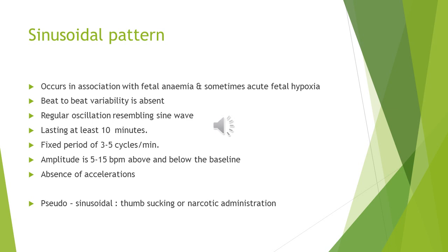However, there's another pattern called pseudosinusoidal, and pseudosinusoidal usually happens due to pethidine or narcotic administration and is not serious. You don't require delivery. And in pseudosinusoidal, you will find some accelerations. It is the only difference between sinusoidal and pseudosinusoidal.